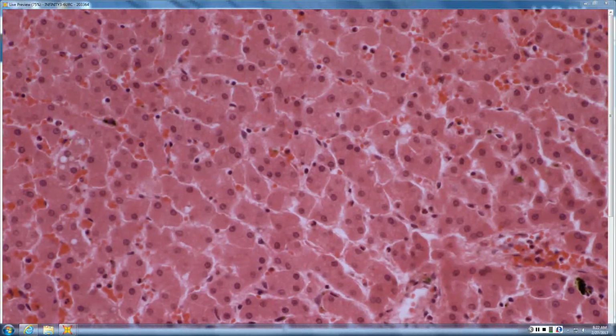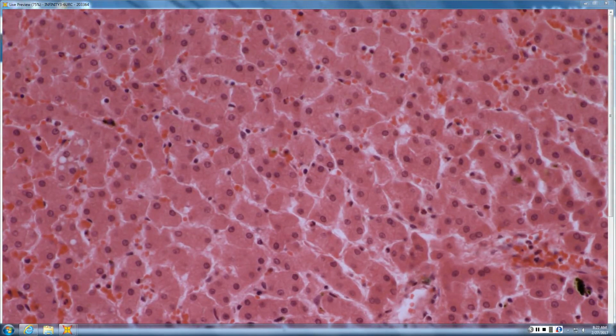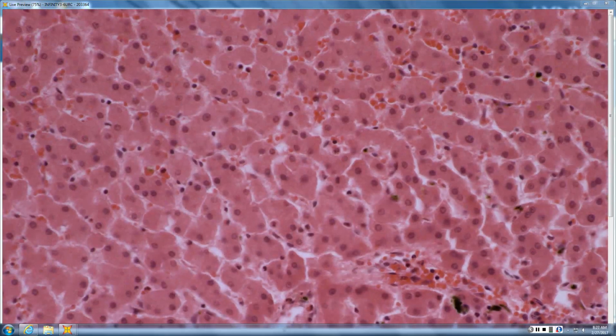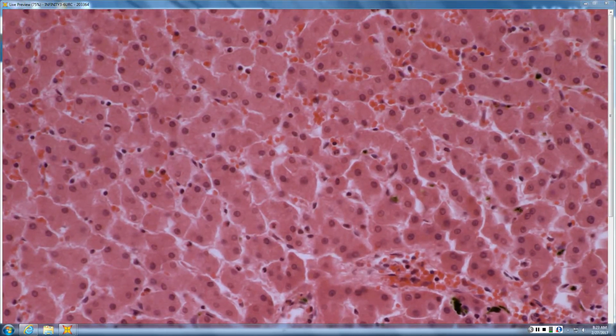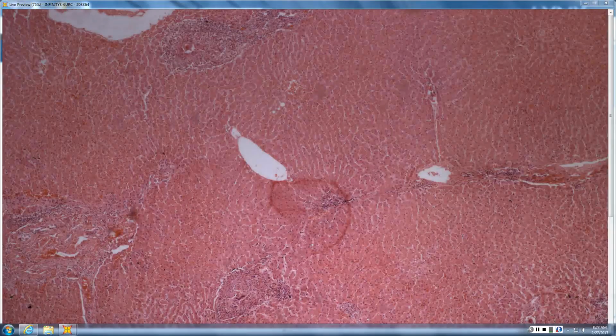It's got these grouped nuclei, and it has a chitinous rim, and it's got a fairly thick wall, and you might even see a lateral spine. So which one? Mansoni. You are correct. With the lateral spine and the thick wall, that would be Schistosoma mansoni.